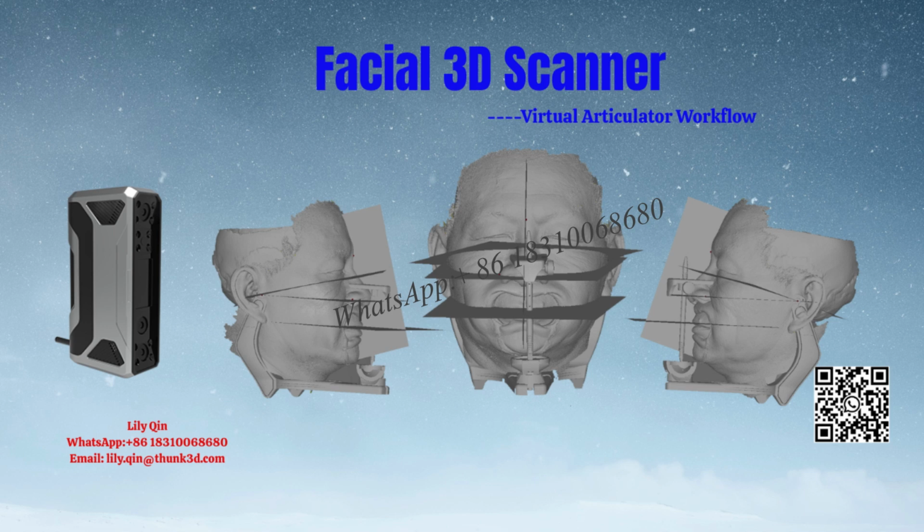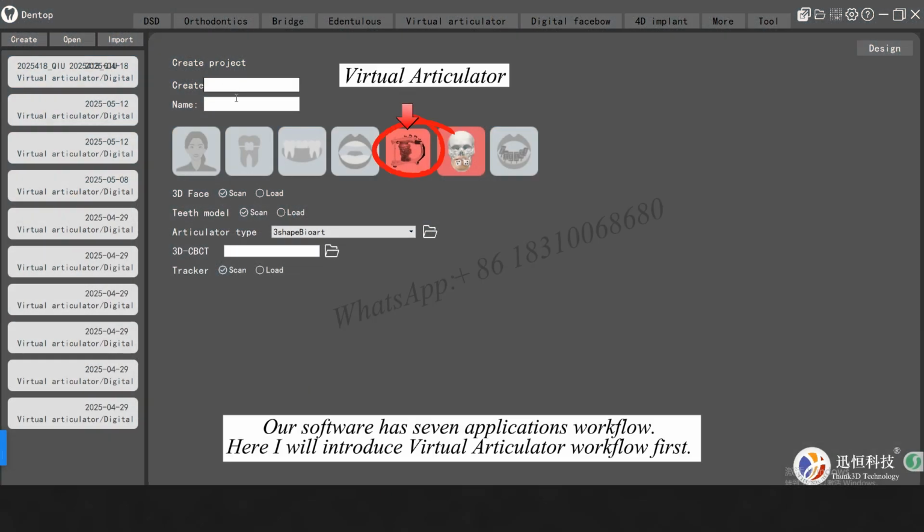Today we will go through our desktop software workflow. Our software has 7 applications workflow. Here I will introduce Virtual Articulator workflow first.